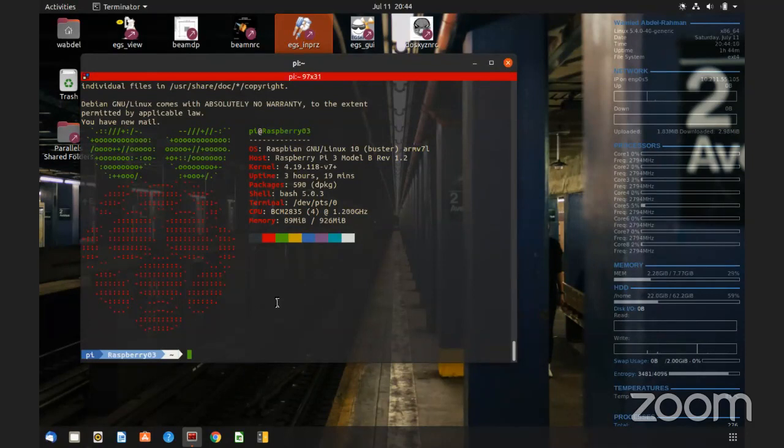This makes sure that the faster machines will finish the 1,000 faster than the slower machines, and then they will go and grab another 1,000. So probably they can grab 4,000 before the slow machine grabs another 1,000. This makes sure that at the end, the simulations finish roughly at the same time. So by the time the simulation is done, out of the 16 million, let's say the fast cores could finish 10 million or 12 million, and the slower cores did only 4 million.